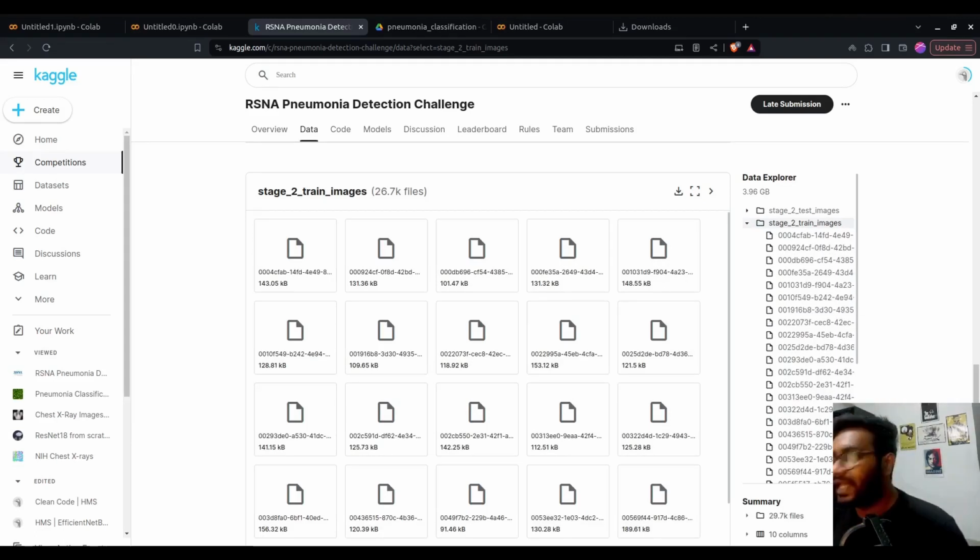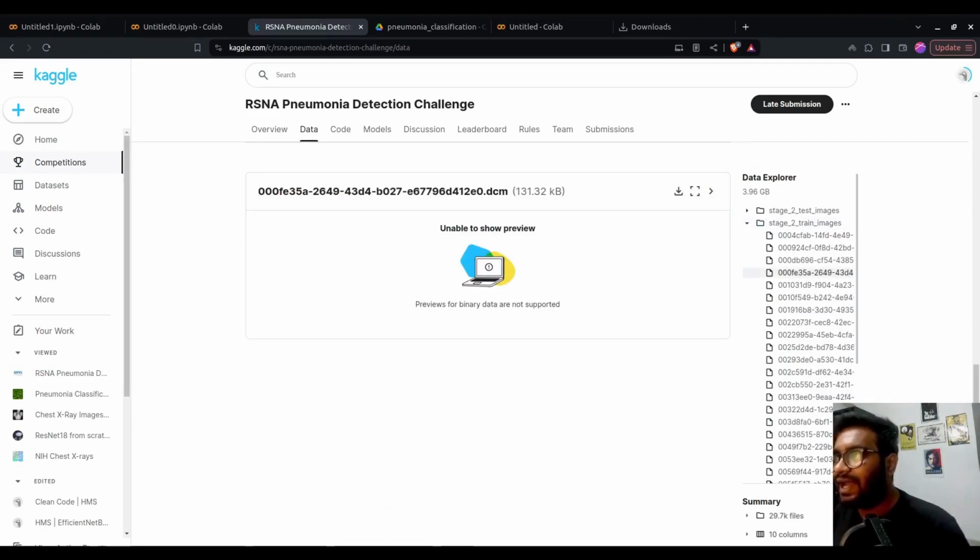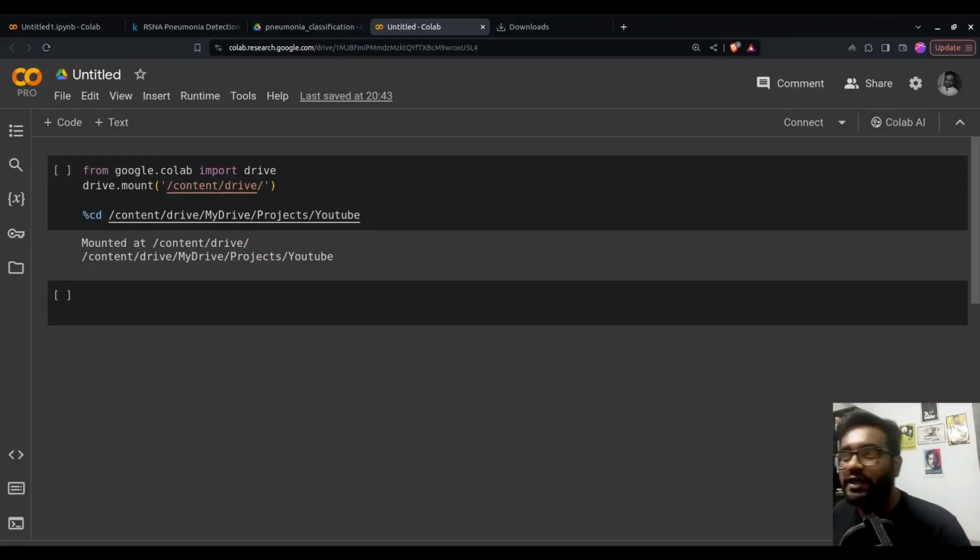Okay, the images that we can find over here are all DICOM files. Okay, to read this kind of files, we need a library called Pydicom. Okay, so we will see how we can do that later. I have already downloaded it and I have put it in one folder called YouTube.